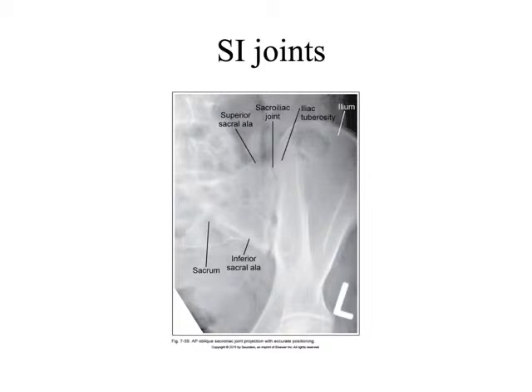How is it aligned? Yeah, you got it. Rutherford's on it. The SI joint is aligned to the long axis of the image. All right? I know this seems really nutty, but if you can help me unpack what we're seeing on this picture, I guarantee you this is a very powerful way of learning this stuff.